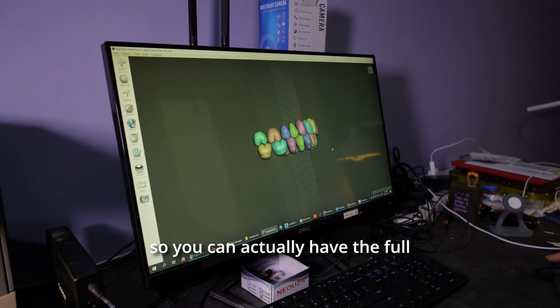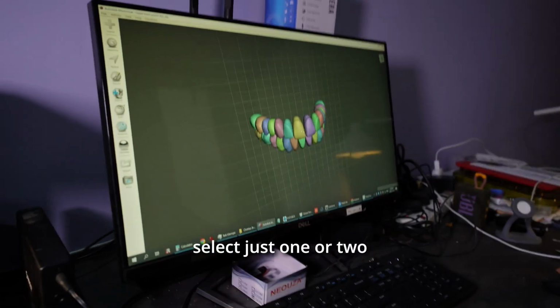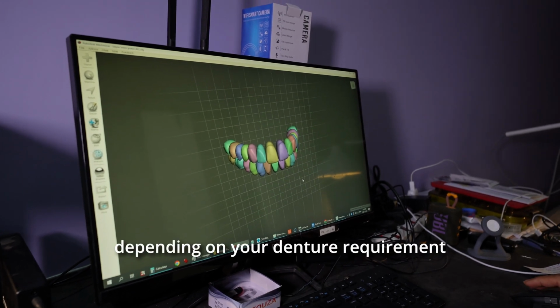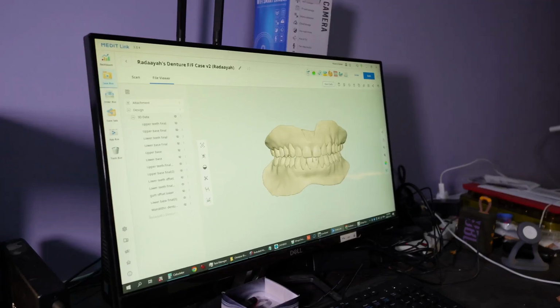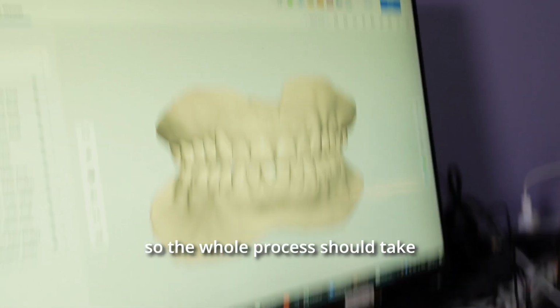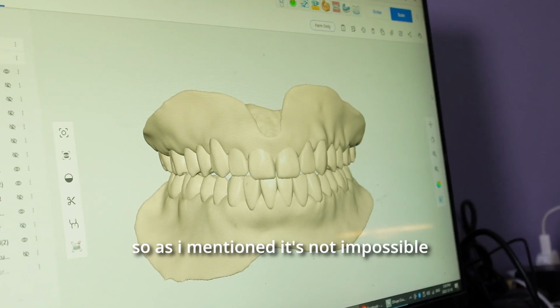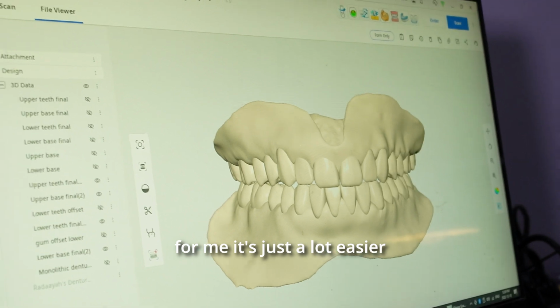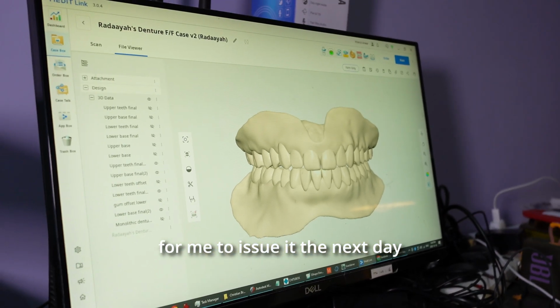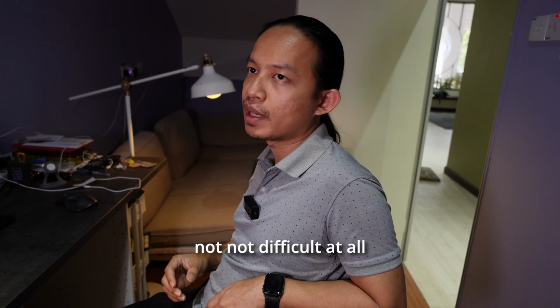You can have the full arch of teeth, or you can select just one or two, depending on your denture requirement. Then the next step will be doing the gum work. The whole process should take, I would say, a couple of hours. As I mentioned, it's not impossible to issue it same day. For me, it's just a lot easier to issue it the next day. That is very doable, not difficult at all.